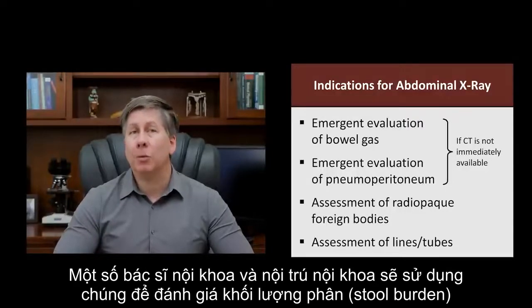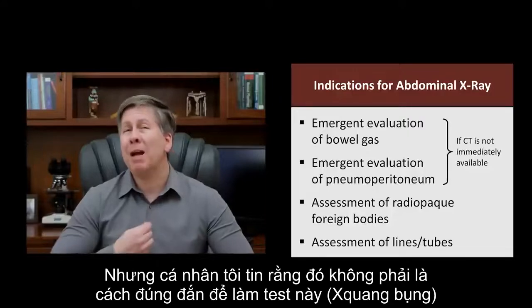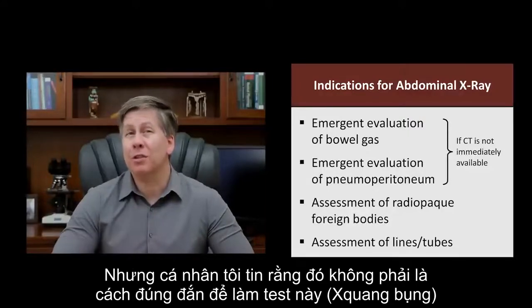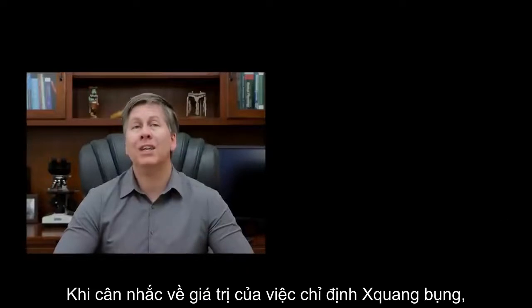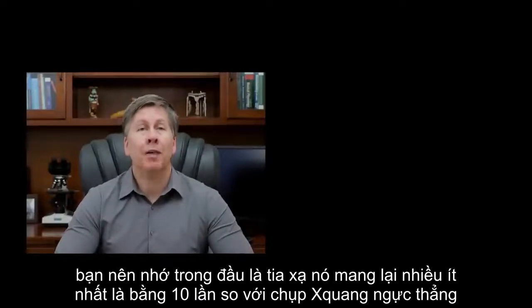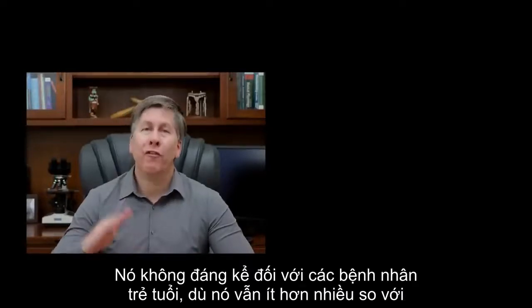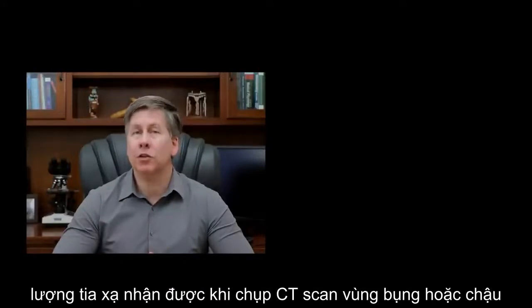Some internists and internal medicine residents will use them to assess stool burden in patients with severe constipation, but I'm not personally convinced that that's an appropriate use of the test. When considering the relative value of ordering an abdominal X-ray, you should keep in mind that the radiation it delivers is at least 10 times that received during a PA chest X-ray, so it's not negligible for younger patients, though it's still far less than the amount of radiation delivered during a CT scan of the abdomen and pelvis.